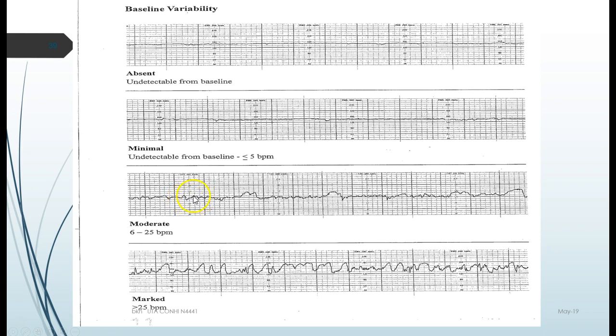Over here we've got about 10. So we've got fuzzies and some bouncing on our baseline. And I'm going to tell you just from experience, this is not part of that. We're going to call that something else when we look at other terms in a few minutes. What we're talking about is what's happening right through here.